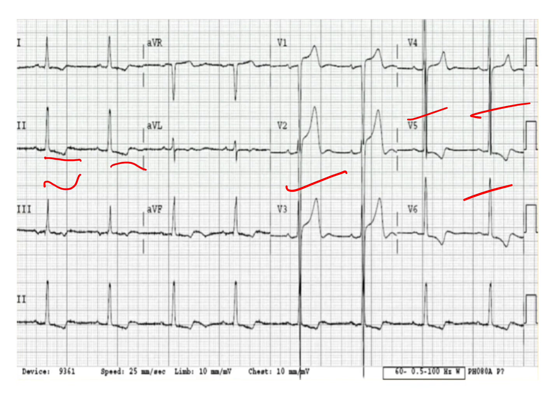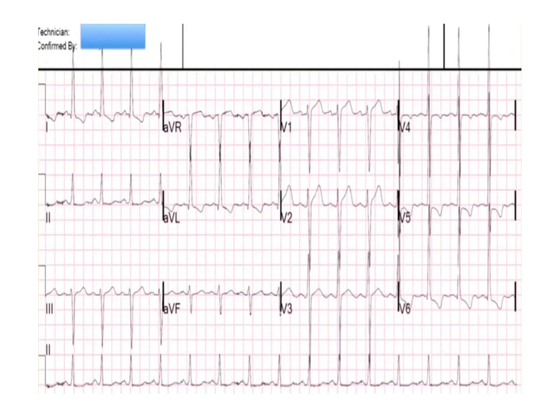And even in this, the T waves are asymmetrical, suggestive of a strain pattern, and the strain pattern is usually seen in pressure overload states. Again, the strain pattern is over here. If we see in this ECG, the R and S waves are almost equal and they are huge. It is suggestive of biventricular enlargement. Even the strain pattern is also seen over there.